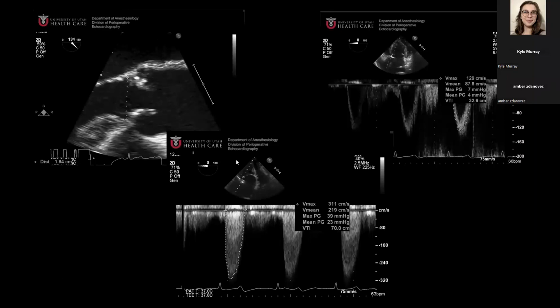So let's say what we're measuring in each picture. This is zoomed up right here. What do you think this distance is measuring here? Diameter of your LVOT. Does it matter what view you measure that in? Typically you measure in the long axis view. And remember, we're using the equation for area of a circle, which is pi r squared, so we're going to take our diameter and make it a radius by halving it in 2.